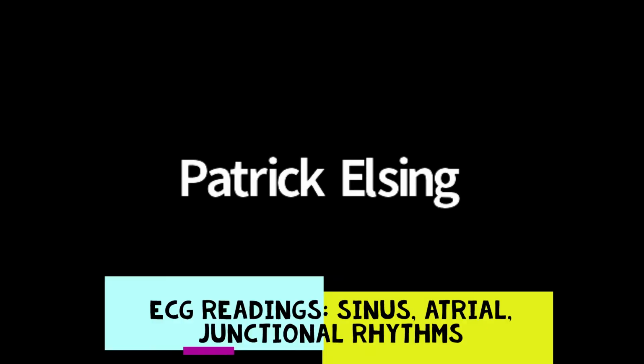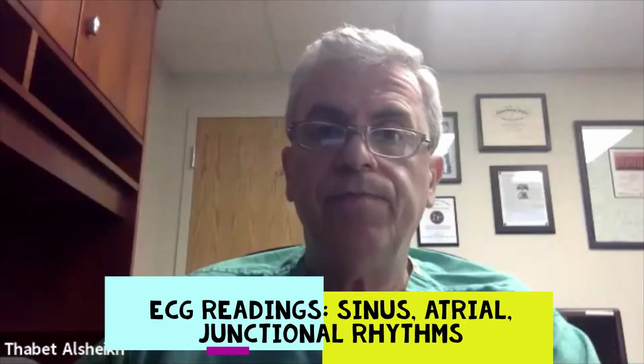Good morning, everyone. We're going to be focusing this morning on part of ECG reading, and specifically, at the end of this 25-minute or so talk, to be able to recognize sinus, atrial, and junctional rhythms by simply looking at the 12-lead ECG and P-wave morphology. So the topic this morning is sinus, atrial, and junctional rhythms.